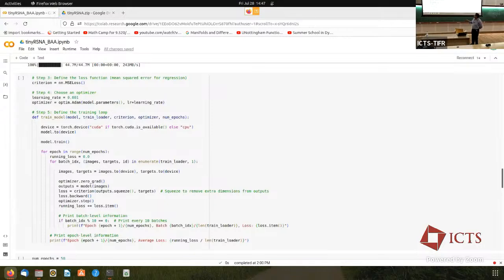Optimizer, we are taking Adam. Adam is a good optimizer. SGDM and Adam are typical optimizers. There's also one, RMSprop, that people use. Between these three, those are the standard optimizers. That's it, and this is the training model. So let's look at the training model class.